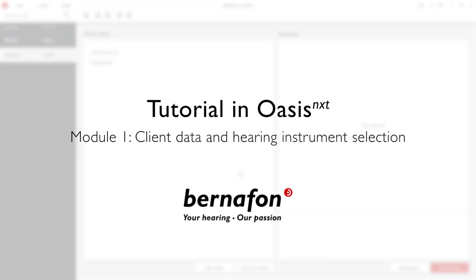OasisNXT is the latest fitting software from Bernafon, and you'll need it to program the Zerena hearing instruments. You'll see that OasisNXT has a brand new, fresher, more modern look about it, and the flow's really streamlined, which is fantastic. I'm going to access OasisNXT through the standalone version. However, you can access it through Noah as well if you want to. In this module, I'm going to cover the client data and hearing instrument selection sections.